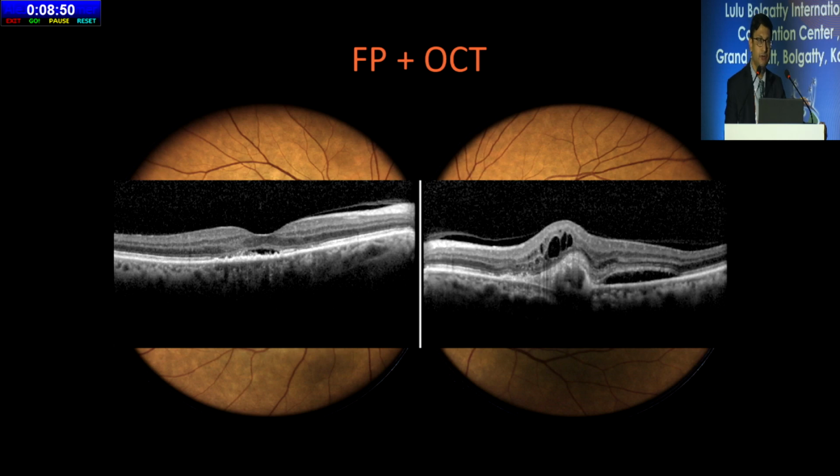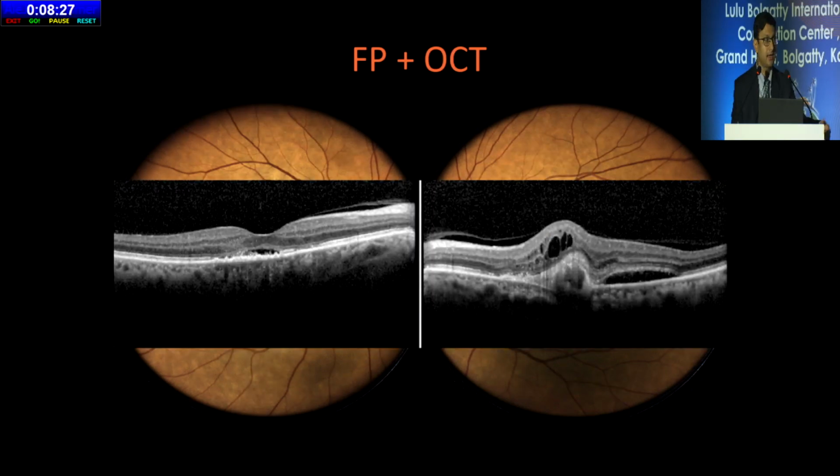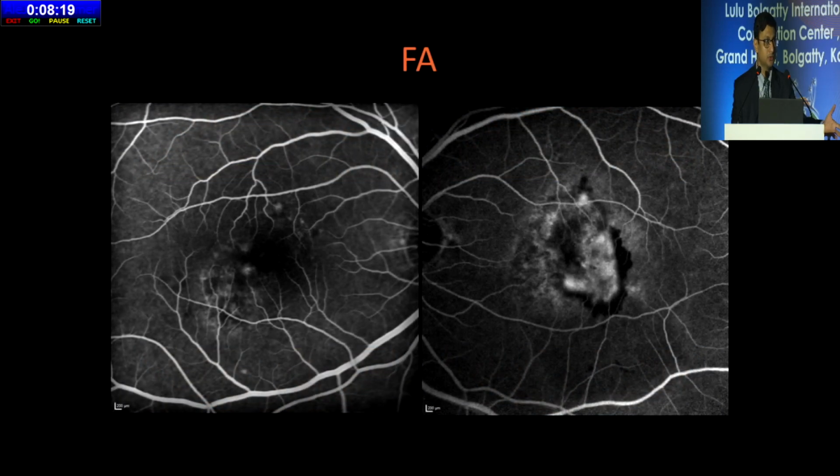But if you really look carefully into this problem, going back to the fundus photograph, you have some neovascular lesion, a grayish membrane, which we classically call choroidal neovascularization, but you don't observe a single drusen in either eye. And this is one very important finding that you should be looking for in all your AMD cases. Now, in general, we like to classify our CNV lesions into type 1 and 2 or mixed. This is a classic case of type 2.